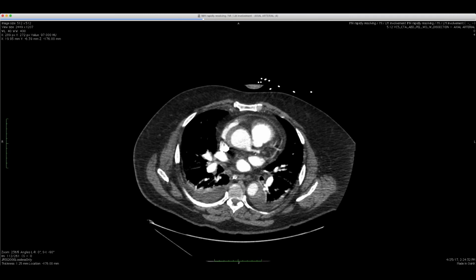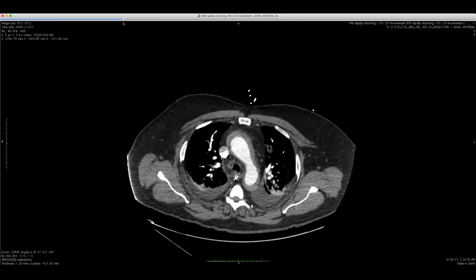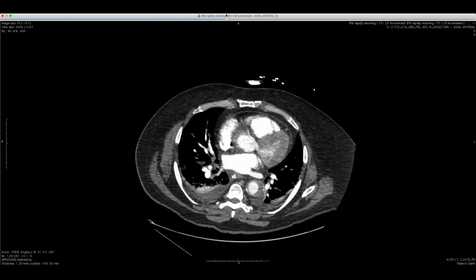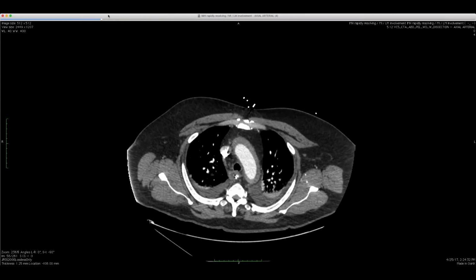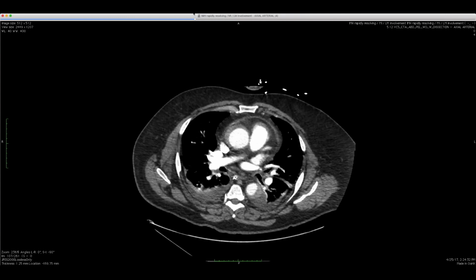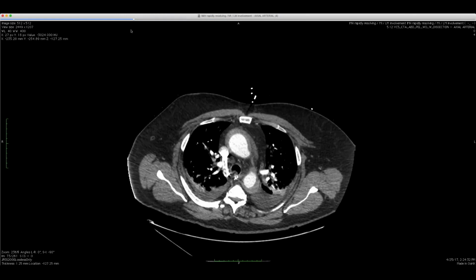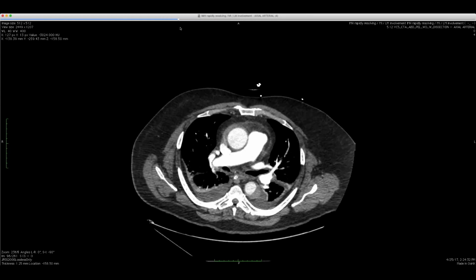And do you think the left main change was actually dissection and stenting in there, and the same process just extending, right? Yeah, because I have seen IMHs evolve a few days later into a classic dissection. Initially you had just a cuff of material around one lumen, and then a few days or a week later, you had classic blood flow in two channels with an intimal flap between them. It's very interesting. I've never seen one change so rapidly like this.